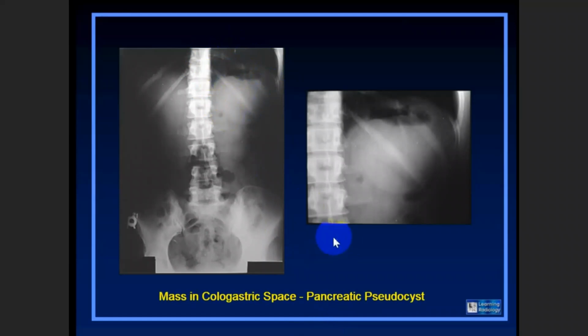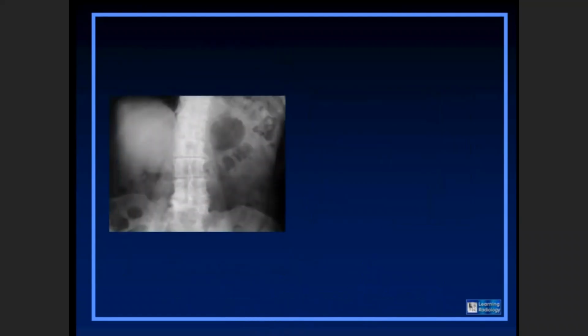It appears as a pancreatic pseudocyst because here is the spleen, and here the stomach, and here the transverse colon, and here is the pancreatic normal anatomical location. So this is a pancreatic pseudocyst from the image, specifically in the tail of the pancreas. Over here, we can notice there is a mass in the right upper quadrant.